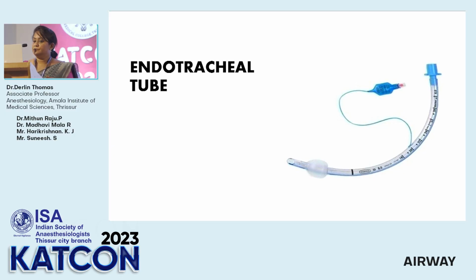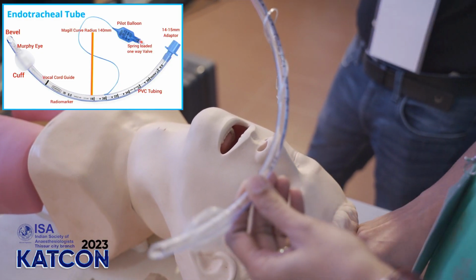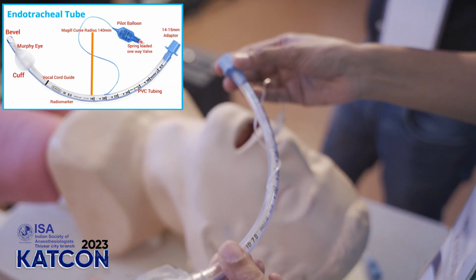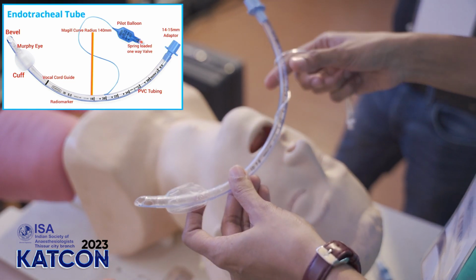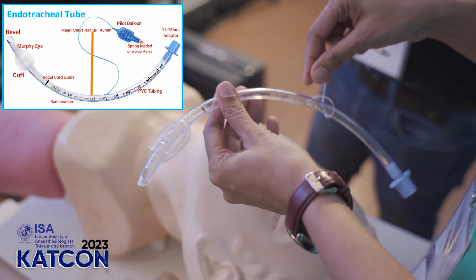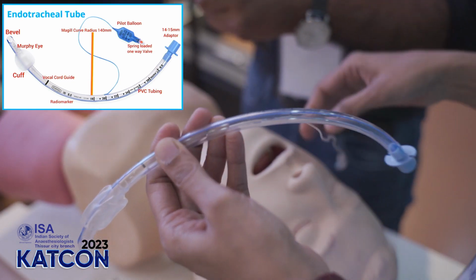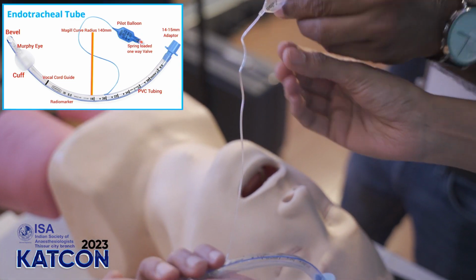Coming to the endotracheal tube, these are the things that we need while attempting an endotracheal intubation. We need a working laryngoscope, an endotracheal tube with a cuff syringe, and an oral airway. So these are the parts of the endotracheal tube. This is the patient end and this is the machine end. At the patient end, you can see a bevel, a Murphy eye, and a cuff. This cuff can be inflated using a pilot balloon, which is blue in color, and we'll attach a cuff syringe at the end of this pilot balloon, and with that cuff syringe, we'll inflate the cuff.